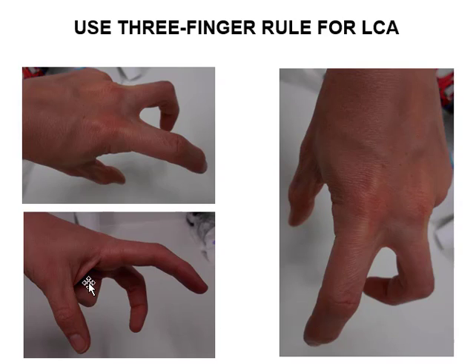Again, the three-finger rule, RAO view, LAO cranial. Remember, the LAO cranial tips the heart forward, whereas the RAO caudal tips the circumflex forward and separates the circumflex from the LAD. And this is that nice profile, showing nicely again how that plane between the circumflex and the right coronary lies together. And if the thumb was longer, the LAD and the PDA would line up together as well.